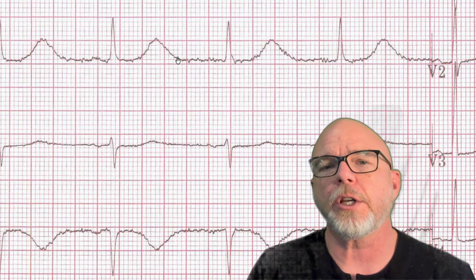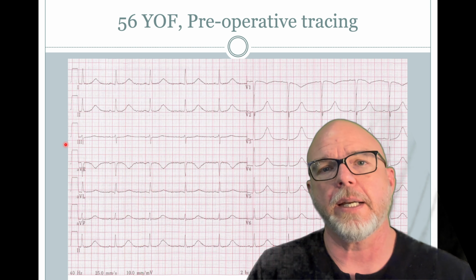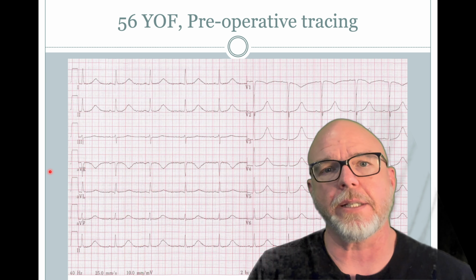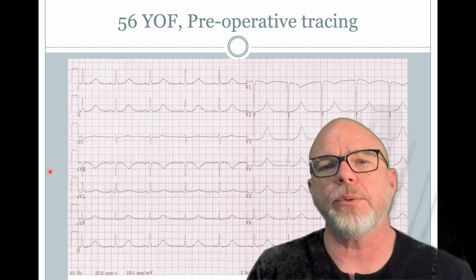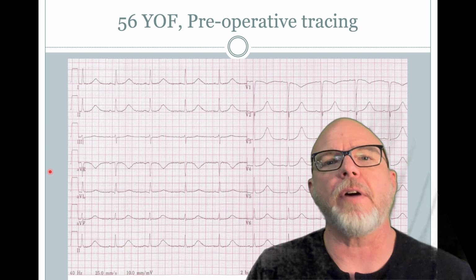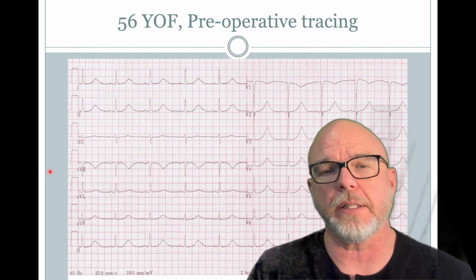This is genetic long QT syndrome, and the QTC, the corrected QT on this EKG is 0.640, which is significant. I start caring about corrected QT intervals, QTCs, at 500 or greater. So at 640, this is definitely significant.